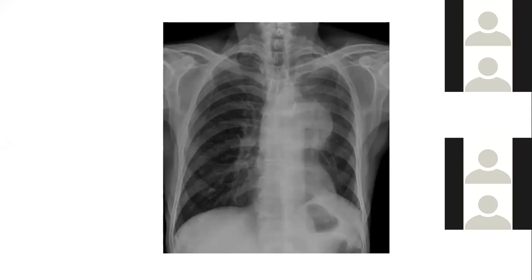Yes. So actually, when the original Felson described this many years back, when there was no cross-sectional imaging, he had described all these signs then. Even in his textbook, many of you must have read, at least I will recommend that you go back and read the older textbooks written by Felson. So he describes the hilum overlay sign as when the lesion is overlying and the hilum appears hiding behind the lesion. So that is why it is called hilum overlay.